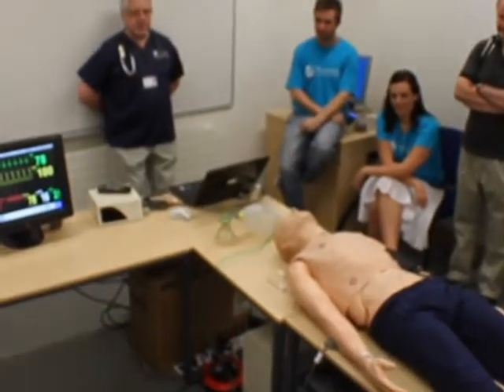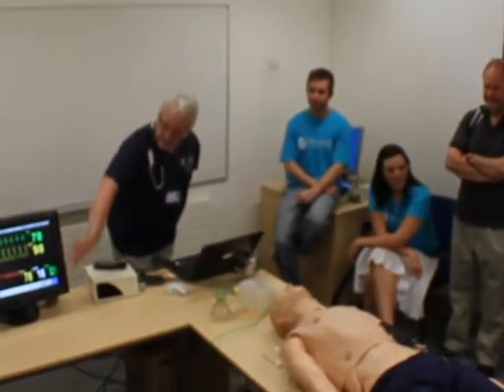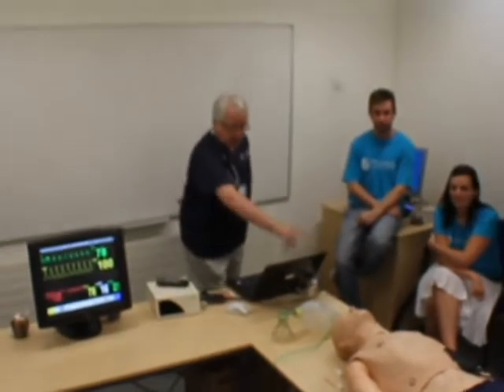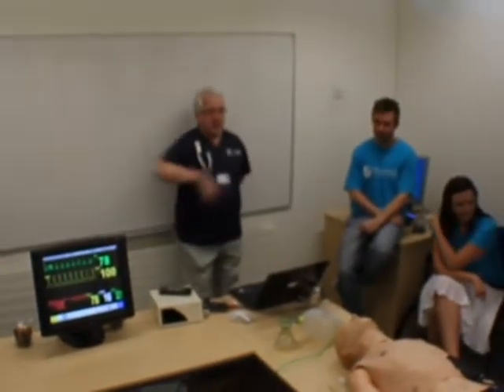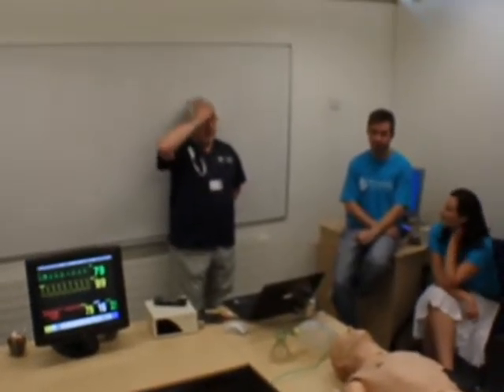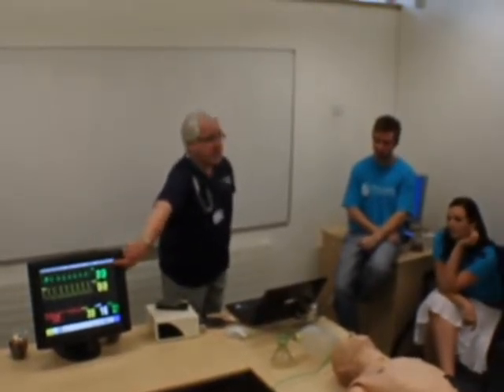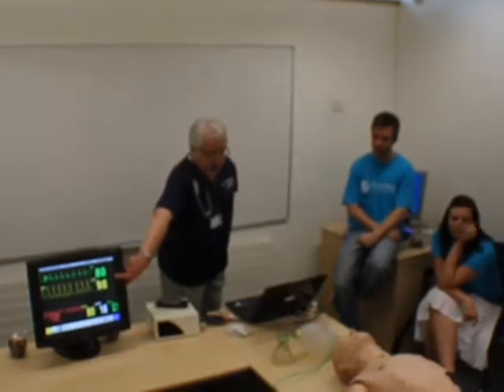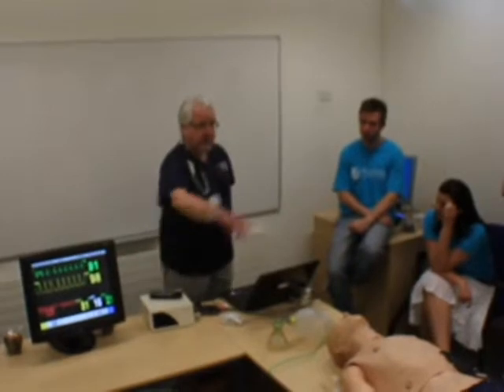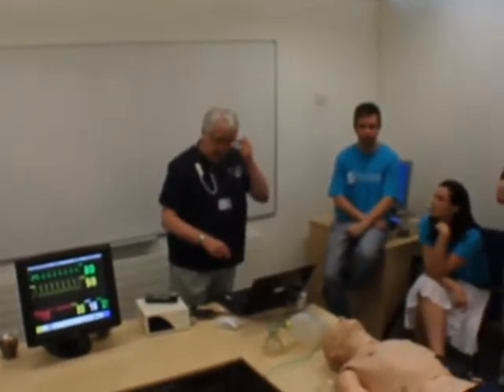And he's a computer-controlled mannequin. So in front of me here, I've got the same appearances on that screen there, which is his monitor, but I've also got lots of other bits and pieces which I can control directly through the computer interface to vary the parameters that we're showing here, which are the ECG tracing with his heart rate, his oxygen saturation, which is in the yellow there, and that's measured by the little clip on his left middle finger.